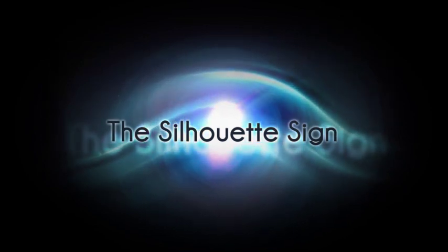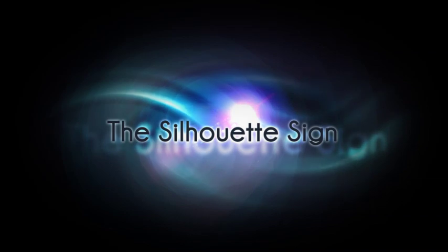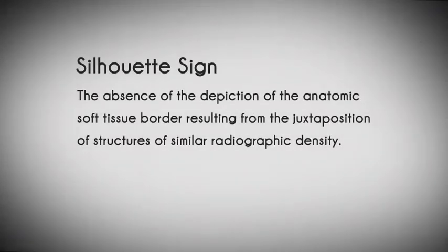This short tutorial introduces the silhouette sign, one of the most important diagnostic signs used in radiology. The silhouette sign is defined as the absence of the depiction of the anatomic soft tissue border resulting from the juxtaposition of structures of similar radiographic density. It can also mean the absence of a normal silhouette. A positive silhouette sign is not always indicative of disease.